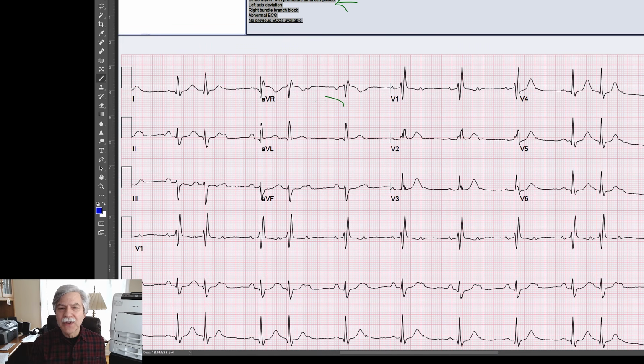I'm not sure if the cardiologist actually picked that up or not, but that's what's happening. You have short intervals and longer ones, and for a while it gets consistently long, and then you have a shorter one again. So the computer saw this pattern, mostly steady, but every now and then you get a premature beat.